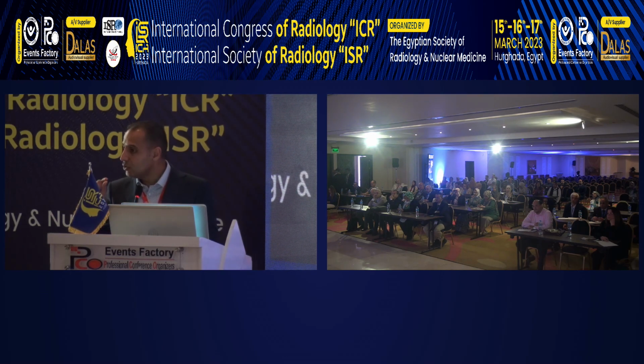You will see only edema at the axillary recess. To be honest, I would not suspect adhesive capsulitis. And after contrast injection, I see the whole capsule show very intense enhancement. When I return to the patient, he describes the classical symptoms of adhesive capsulitis. So, short answer: yes, I would recommend contrast in cases with suspected adhesive capsulitis.